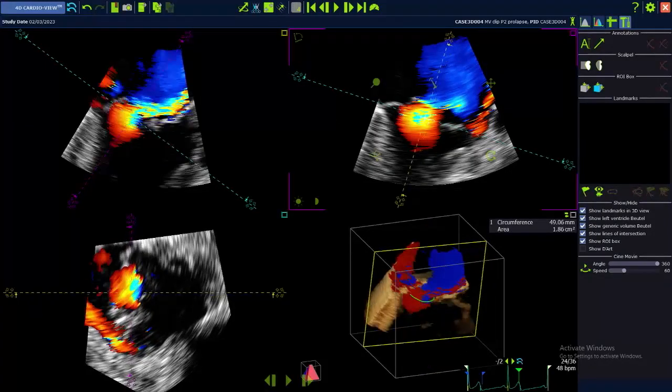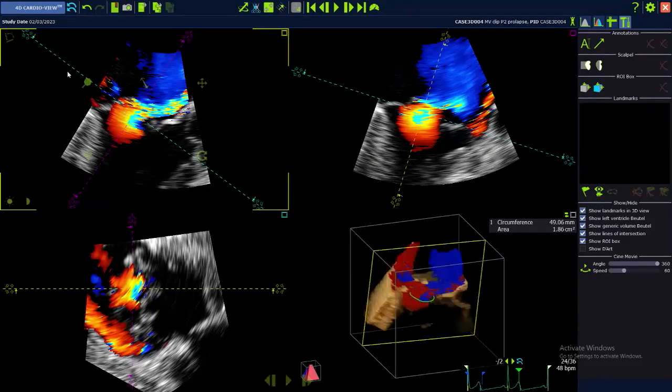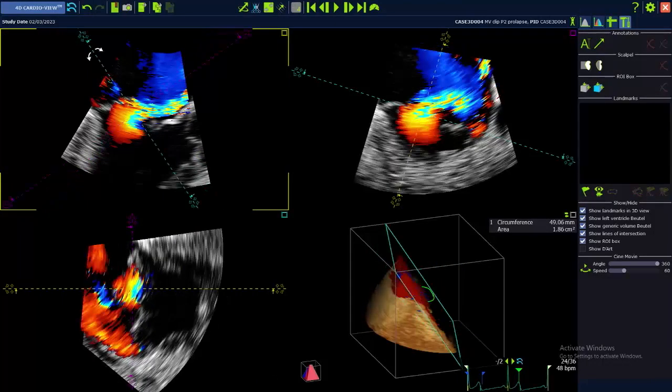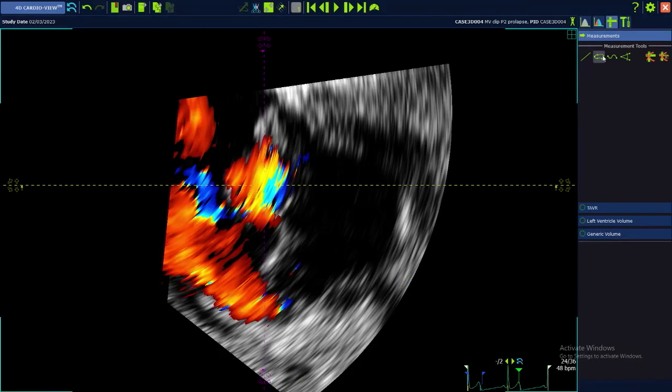And this one would go right through the center there. It's obviously a little challenging with a prolapse case, but I think this is probably a little better. Something like that. I assume, are you okay with that? Yeah, okay. And so the same process, like I mentioned, this is the short axis. You would click on that, bring that up. I won't remove those planes again for you just so I don't waste your time. And then I'll go to my area, and you'd measure that.